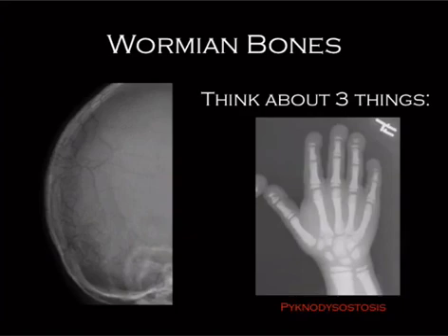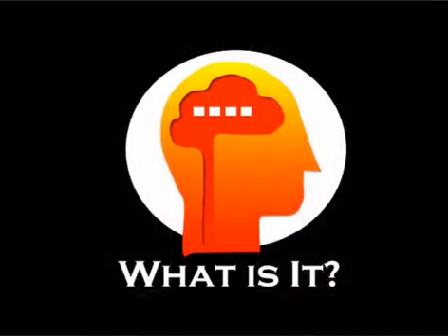And the last one is the P in PORK CHOPS, which is pycnodysostosis. What is pycnodysostosis? It's a bunch of different stuff, but the thing to remember is that it's basically osteopetrosis with acro-osteolysis. Notice the fingertips, so they like to show it with a hand. Fingertips out, dense bones. These kids also have a wide-angled mandible. It's a buzzword, and of course they've got Wormian bones.